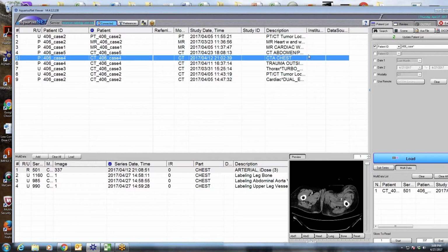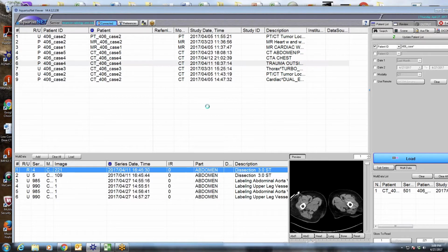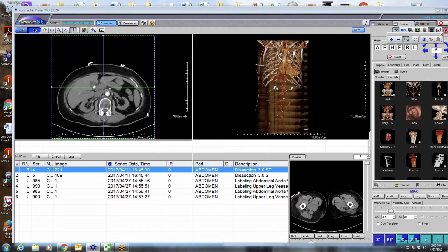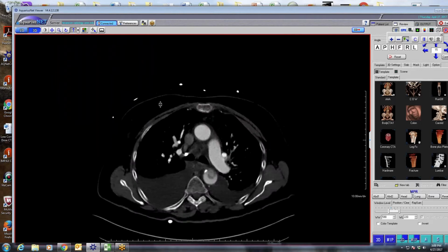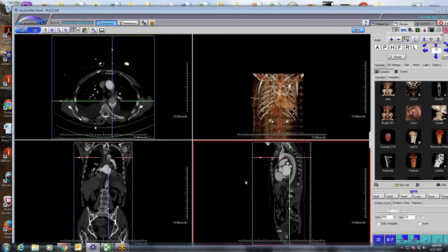Not really sure why. Yeah. That's awesome. And I think the other thing too, Seth, is it shows why there's slower flow along the undersurface, which may be why all those thrombi always occur. You know, the aortic thrombus always occurs in that location. That's actually quite interesting. I mean, you're right, they do. I never really thought of that.